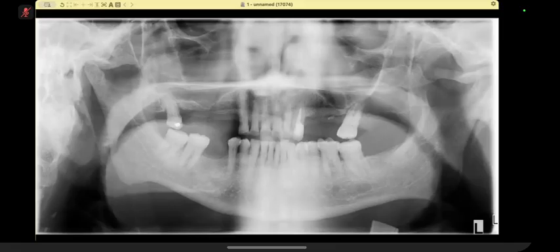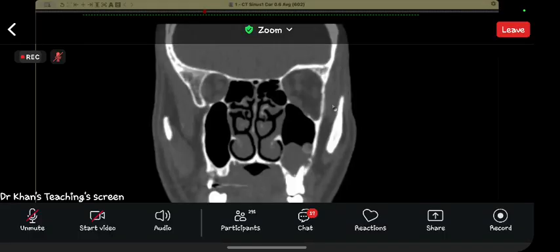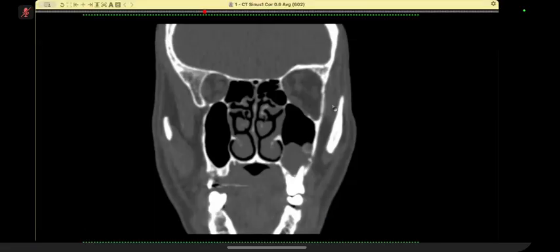Okay, just hold on, please. Just hold on. Sir, should I start? Yes, please. I've been presented with coronal images of the CT paranasal sinuses.